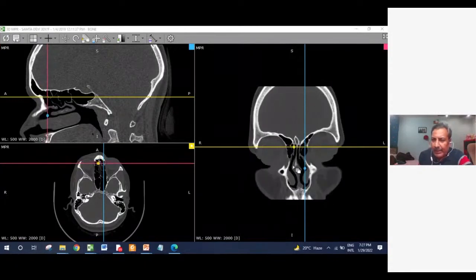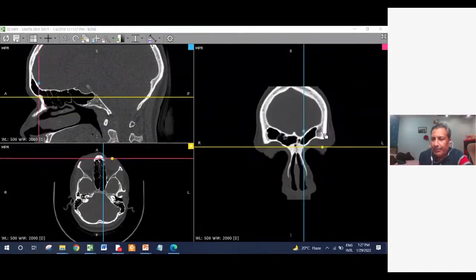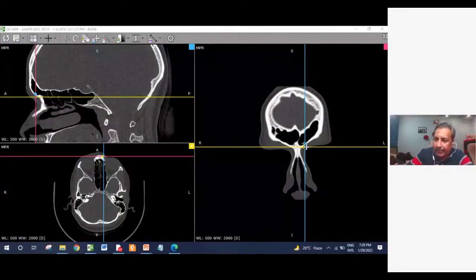So the important thing is how to look at the frontal sinus from anterior to posterior. Number one, how big, how pneumatized the frontal sinus is. This is very important. Sometimes in decision making, when you have massive frontal disease, particularly in a revision situation, if you have multiple revisions, which we come across very often, in that situation you have to take a call of either Lothrop or osteoplastic flap or something like that. For decision making, the pneumatization of the frontal sinus is the key factor.